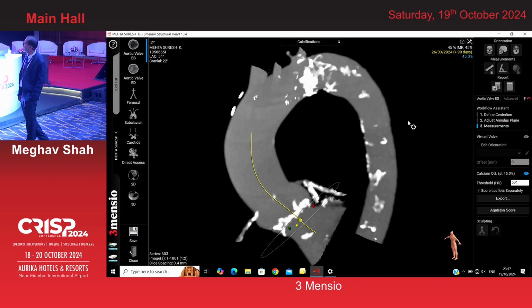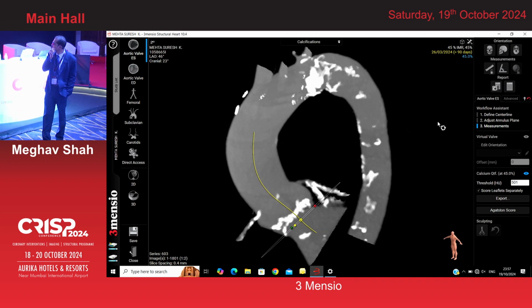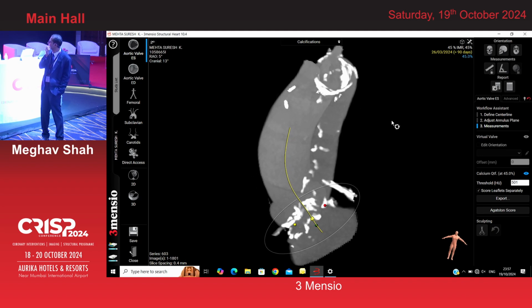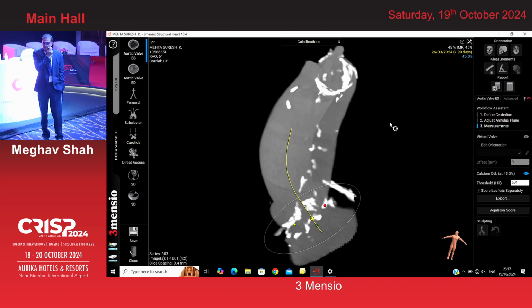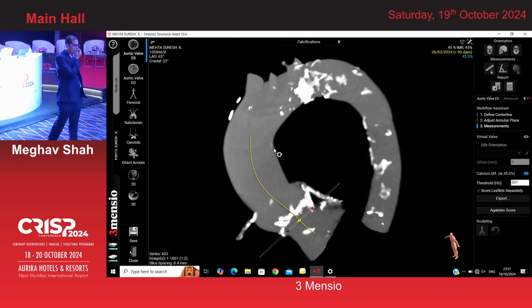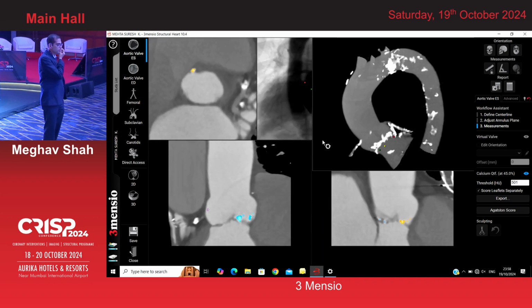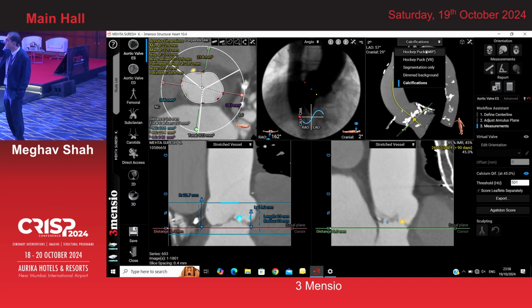And lastly, this is the constructed image of the aorta, in which you can see the white echogenic things are the calcium. So it will just give us an idea as to how calcific the aorta is, and how careful we should be while putting the big devices across it, because there is a chance of stroke.